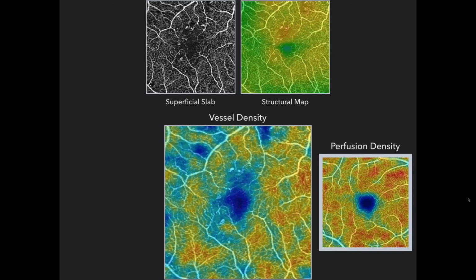I am not going to go into the mathematics of calculating each, and frankly, some of it is proprietary, but I want to stay on point here, noting that there are numeric ways to look at the OCT-A. But of course, these are just visual maps, which is to say a visual representation of the numbers. As you can imagine, you can get much more granular.